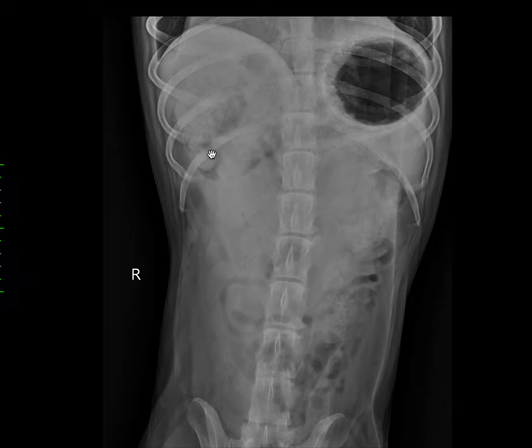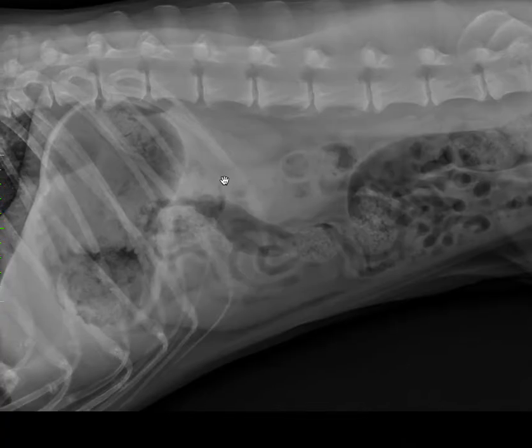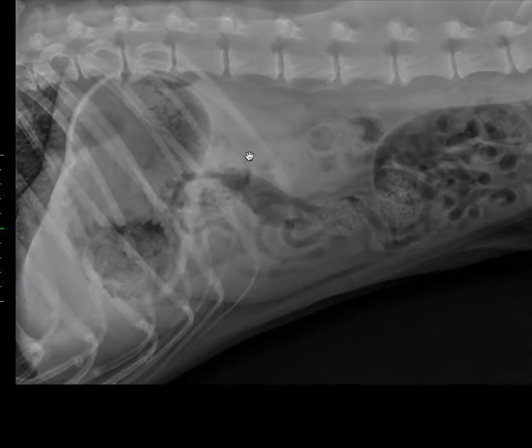It's not uncommon in dogs for the ascending colon and cecum to be positioned more here, but for whatever reason in this case, some of the colon has taken a little bit of a loop in that direction. It may actually loop back around in this case where we see this granular contents, but I can't tell you that for sure. If and when you're assessing a case and you feel that you're not sure where the colon is, I would suggest doing a negative contrast colonography using gas. This will help you to evaluate the colon and give you more confidence about its position.